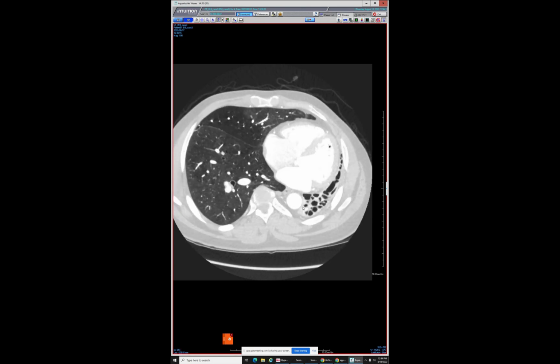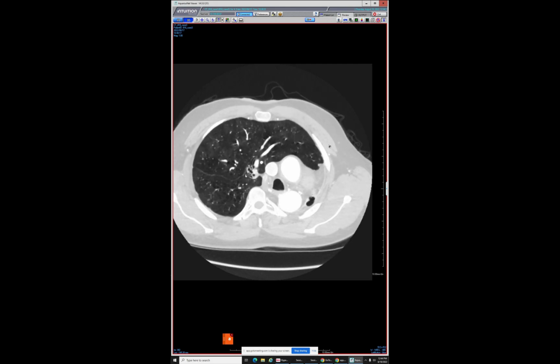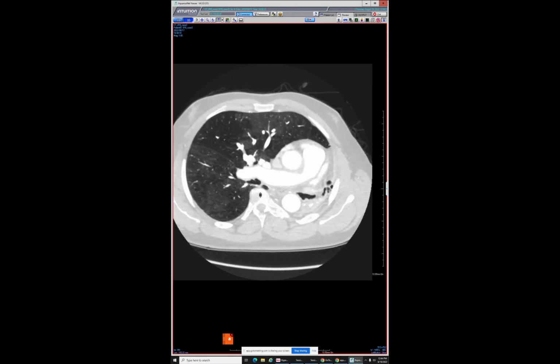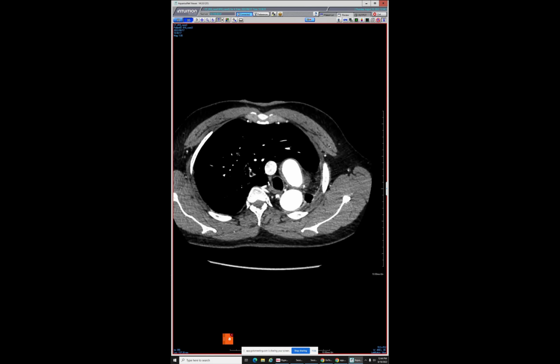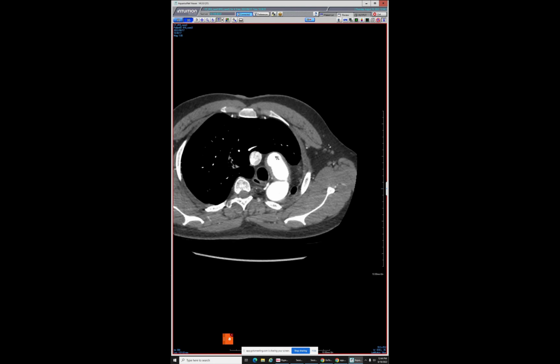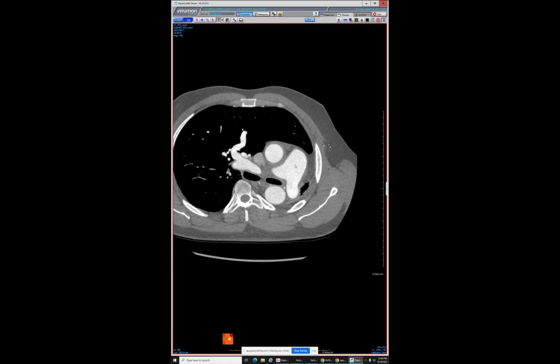So it could be TB, but the right lung, look at the right lung. And he's a non-smoker. The right upper lobe is basically just this little thing up there. It's a strange case. I'm having trouble putting it all into one diagnosis. Some bad childhood infection, or young adult infection. The fact that his left PA proximally is so fat tells us that this happened after he'd achieved probably 10 years old or older, just by the caliber of that vessel. And it also tells us it's not congenital, like a CPAM.